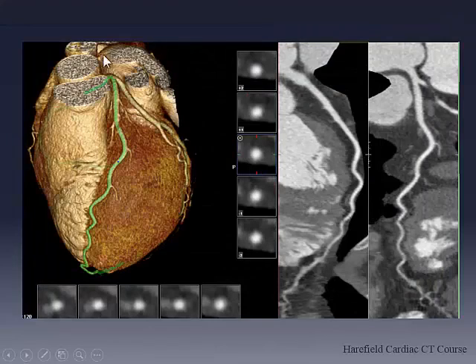Okay, so here, does everybody know what vessel this is? So it's the anterior running on the left, so it's the LAD. So that is going to be a branch, probably obtuse marginal, I would guess, because the AV groove is back there. So this is still nevertheless a branch, isn't it? And here you're just picking out the LAD and you'll see how this works. But basically, volume rendered image, very nice for presentations and everything else, but not really of diagnostic value.